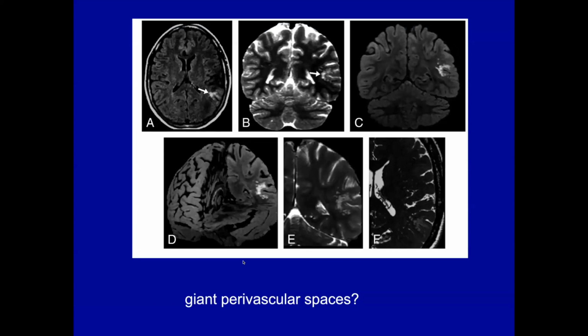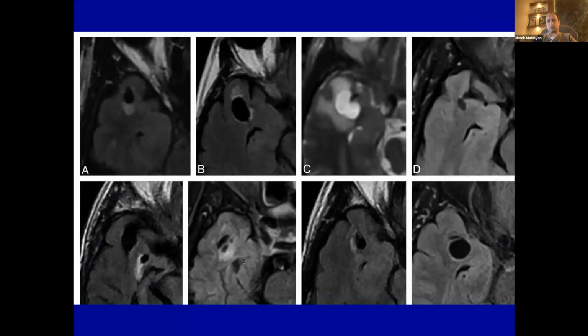I have a question, dear. Yes, Kostan. So why don't you think that it might be something, for example, post-traumatic or something like that? Because the gliosis is not small, the zone of gliosis. Do you agree with me?